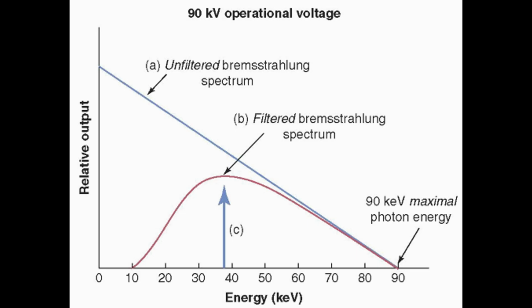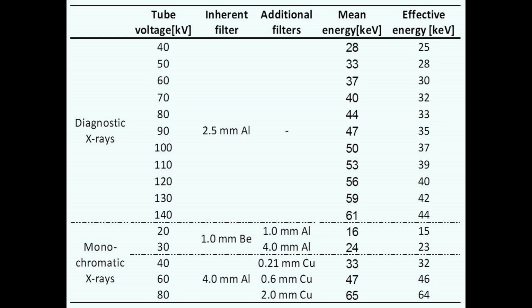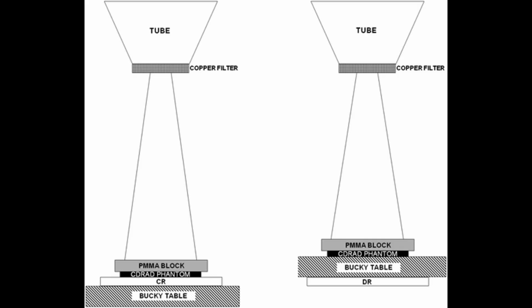Patient protection standards define the minimum required filtration, and this is part of the system's quality control. In some applications, special filters or pediatric filters are used to reduce dose in young patients. In some modern collimators, the pediatric filter is built internally so that pediatric imaging can be performed with proper dose without physically replacing the filter.